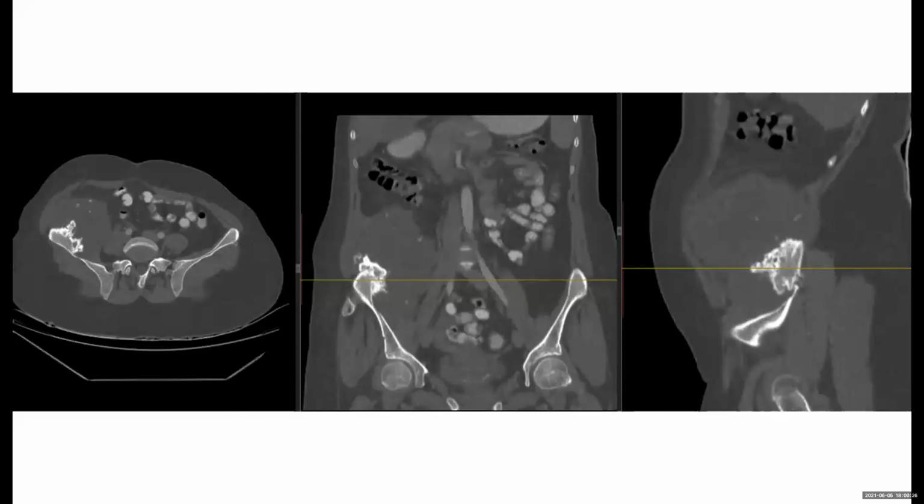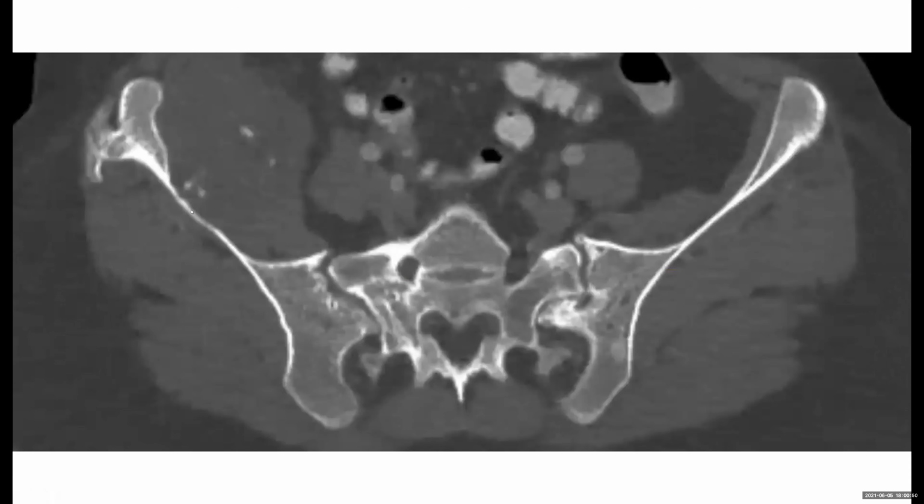So this is the bone window. Yes, it can be an osteochondroma with malignant degeneration into a chondrosarcoma, keeping in view this polypoidal appearance. Can you see some other lesions? Yes, I can also see some soft tissue lesions scattered anterior to the sacrum in the pelvis. This can be metastatic lymph nodes. Okay. So what are these lesions?